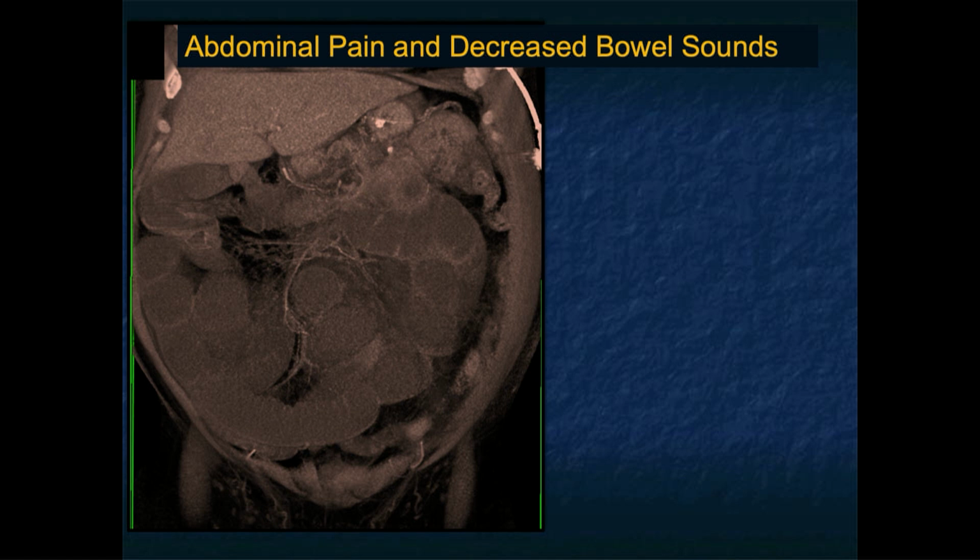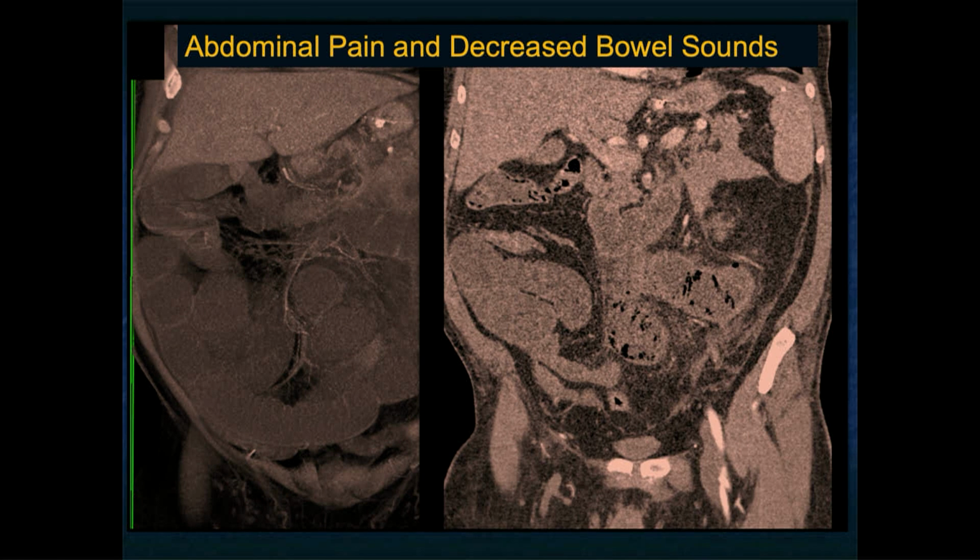This patient comes in with abdominal pain. Nothing really specific on the clinical history side. If you look at these images, it kind of looks like a non-contrast study, but the patient did have IV contrast. And the bowel is just not enhancing enough.